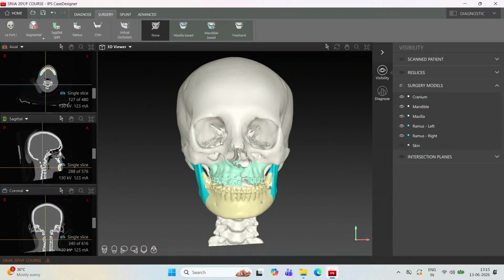Will you just check if everybody is done? I think everybody is not done, and they're not asking for help also, especially that group. No, no, no. We're just done with the slicing and other things. We'll have to do the planning, and then the splint. Yeah, we can do it if they're all done, but all of them have some trouble with everything, I guess. So they're just addressing one by one.